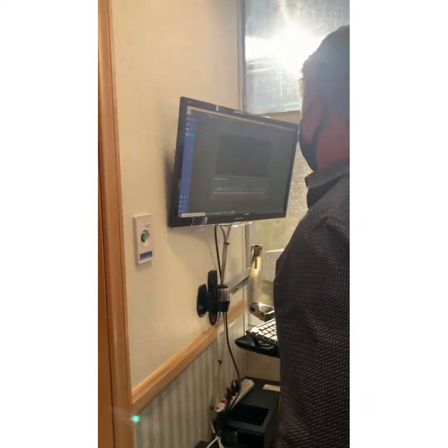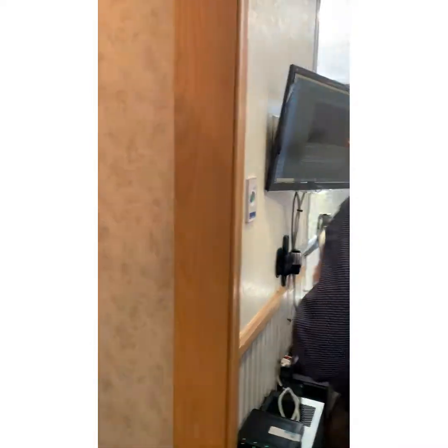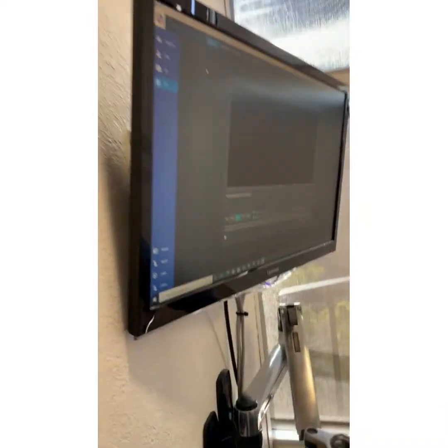So what do we... It's going to work. We wouldn't have to go through all that, right? We would just go to the patient, it's just the R, a little thing that Moses missed when he set it up. I know how to fix that kind of stuff. So when we press R, this is where it would take us to. That's right. No, I'll show you. Just a minute.